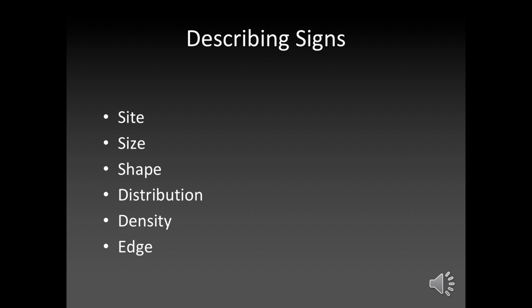You need to be able to describe the shape. Radiologists come up with really clever and flowery language to describe what they're seeing, but most people just need to use nodular if it's round and reticular if it's straight, and if something's a bit cloudy you can call it cloudy or patchy. You need to be able to talk about the distribution.